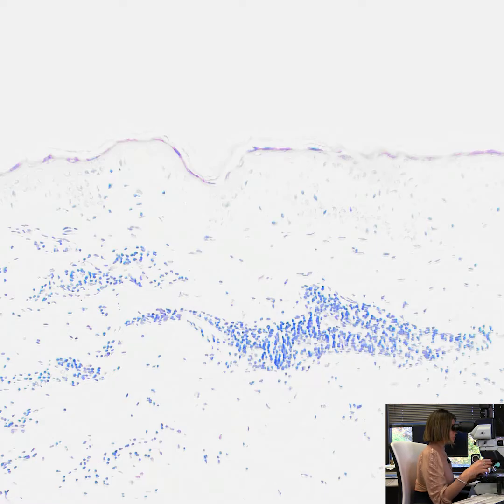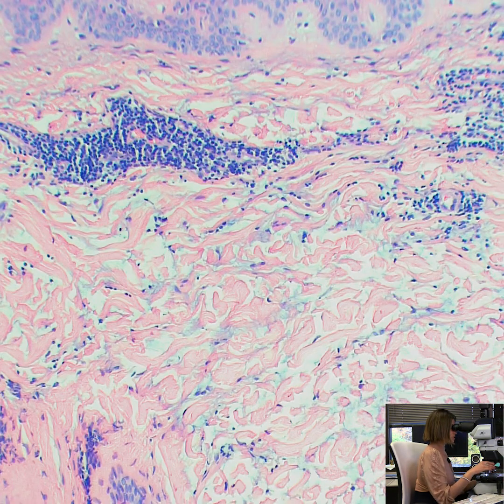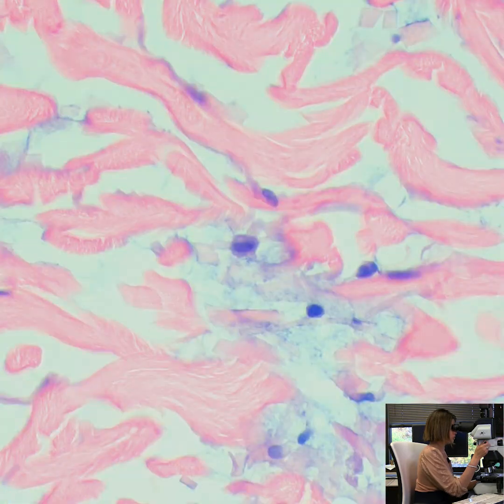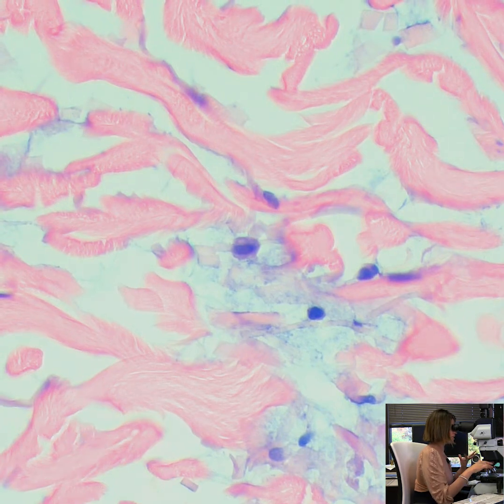Another finding in Tumid lupus, which is essential and completely important for its diagnosis, is the presence of interstitial dermal mucin deposition. You can see that in between and among the collagen bundles there is a stringy mucinous basophilic material, which is all mucin. The mucin is pretty easily identifiable, but it's not in-your-face mucin.